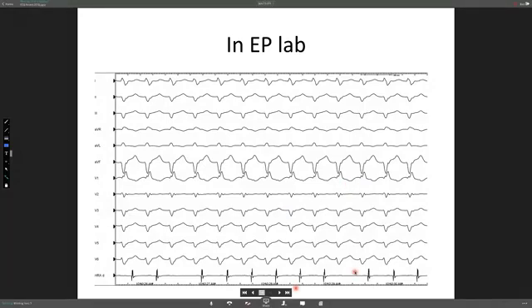So, of course, now we know this because we're looking at the intracardiac electrocardiogram. So I can tell you 100%, and this is in continuation to the question brought earlier by a couple of the audience about the T wave and the P wave. We know the P wave in this patient should lie somewhere here in this part of the T wave, and the fact you don't see it here indicates this is diagnostic of VT. This is V more than A. This is diagnostic of VT.